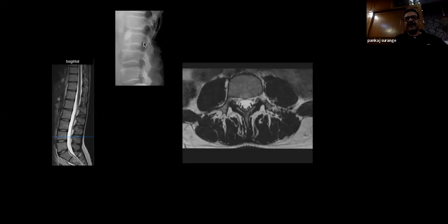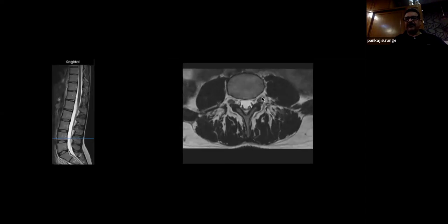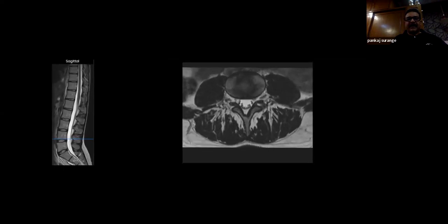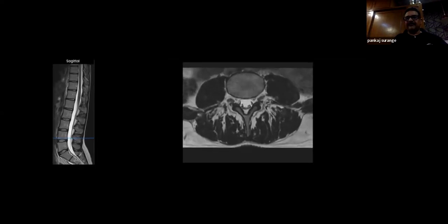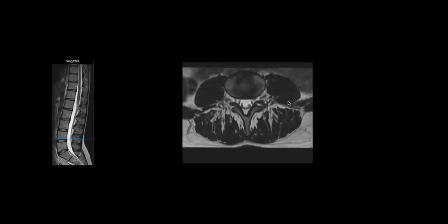We have vertebral body, we have a nerve root. Okay. As we start going more down, you can see this exiting root is going out of the foramen. Okay. And now look at this. Now we have reached the end plates. So when we reach the end plates, you see the change in the color of this. Can you see? Can you make out that? Okay.